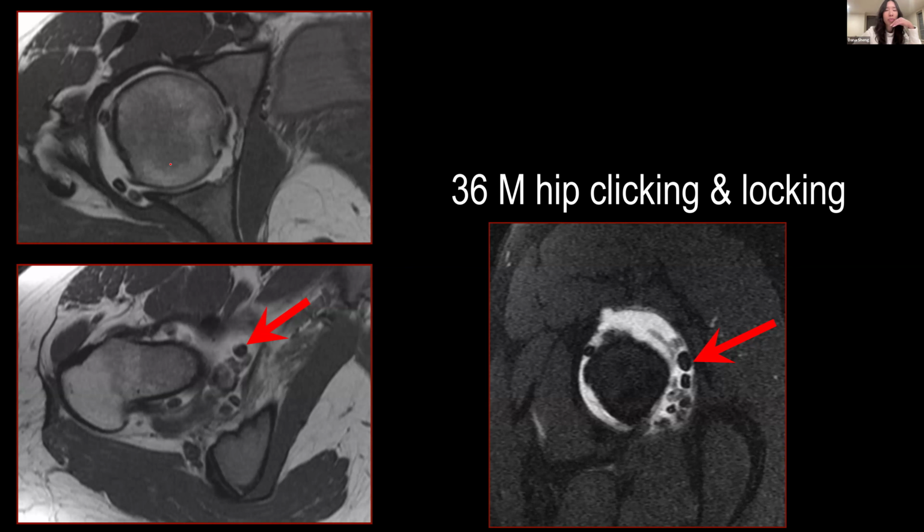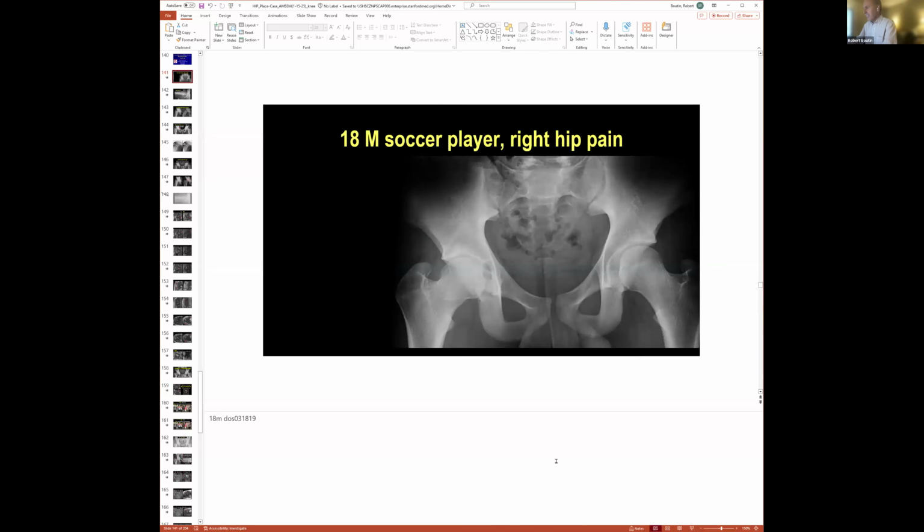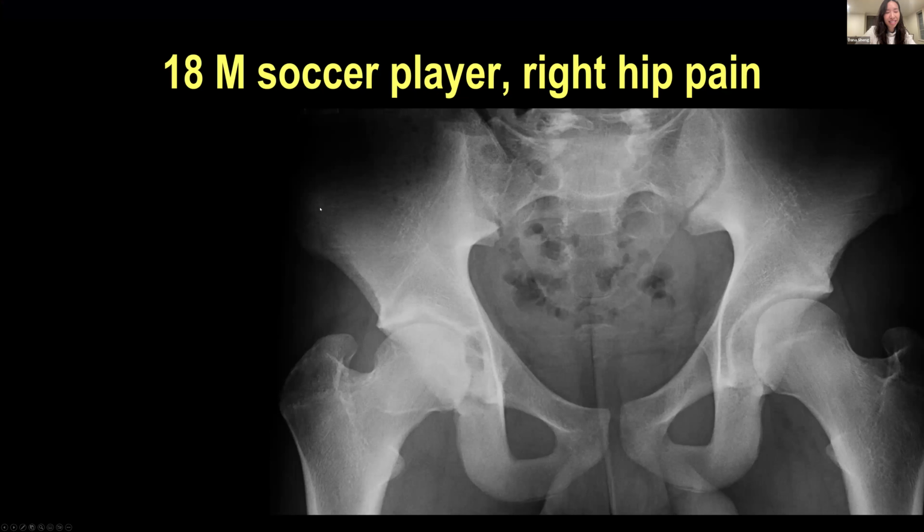Thank you. I know you said it would need to be another lecture series, but I was just curious, with one of our AP pelvis images that you have, could you just draw how you would measure the LCEA? Just for anyone who doesn't know. Sorry to spring that on you. No, spring away.